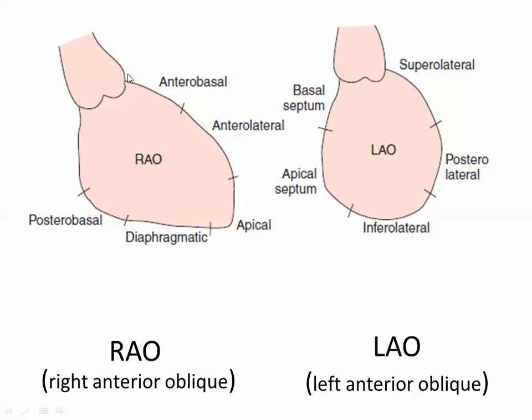So this is anterior, posterior. Okay, from this you will know why I emphasize this point, because you will know the course of the anomalous artery. It is an interarterial course, a malignant course, or the artery is anomalous but retroaortic, a benign course. Okay, so there no intervention is needed. Okay, it's clear.